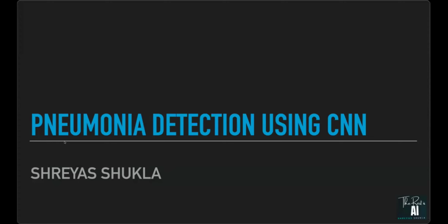Hello and welcome back to the very first project on this playlist, a playlist on deep learning projects, where we'll be building a bunch of projects on deep learning. And today, the first project as a part of this playlist is the Pneumonia project, where we will be designing our neural network and training it based on certain chest X-ray images. So without further ado, let us get started and see what it has in store for us.